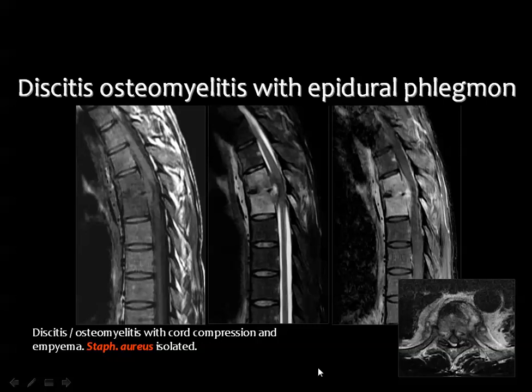And you remember, or you should remember, that bone marrow edema of whatever etiology, traumatic, inflammatory, neoplastic, will enhance after injection of contrast medium. Bone marrow edema of whatever etiology, if you inject contrast, it will enhance.